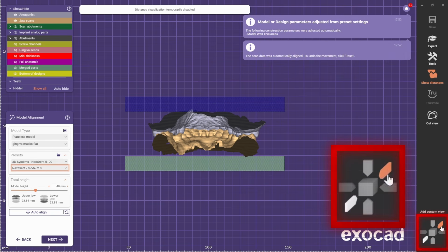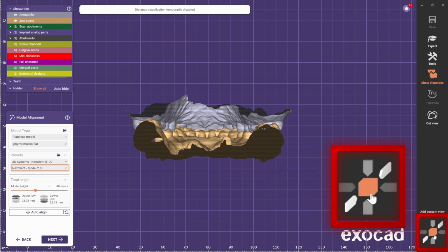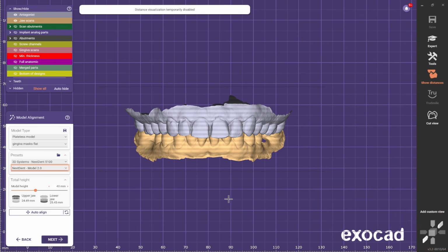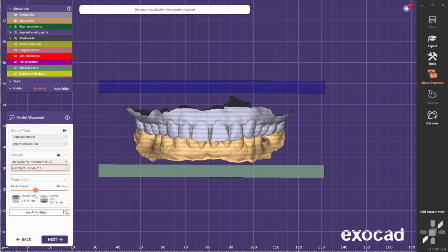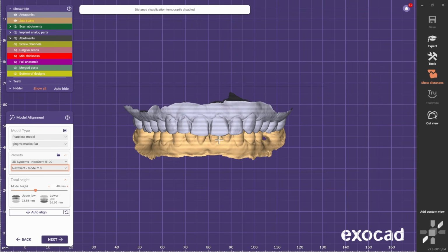Flat. So usually I like to choose these views that you have here, because if this is looking from the back, I go look at it from the front. And it makes the bases almost invisible, so you see this, the upper and lower base. You can change the height, but usually I like to keep it at 40 if possible. If not, I change it. So you come here, I bring this one a bit more.